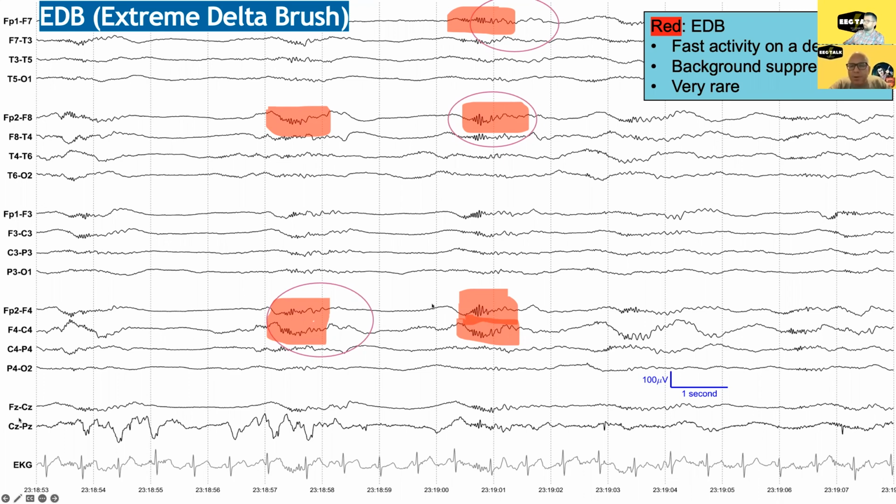I think so. Now, actually, one question: what's the phase relationship? I guess it's on the down part. Yeah, that's what I thought too. It's not the clearest example. We don't want to put this in an educational video or a textbook. Yeah, we would never put it on EEG talk. No, never. It would confuse people, for sure.